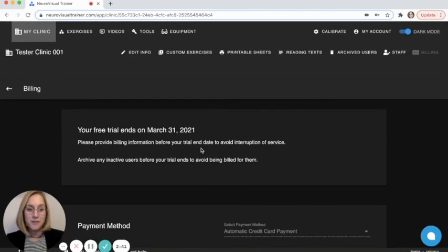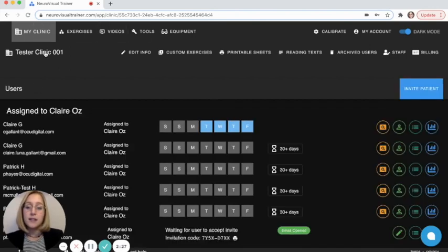So that was really the runaround. So we had a look at the billing. So how do you input billing information if you do want to go ahead? Intimately linked is the actual patient pricing. And then also, what is an active patient? Because it's the active patients that get billed. And then we also had a look at archiving the patients and setting expiry dates on those patients.